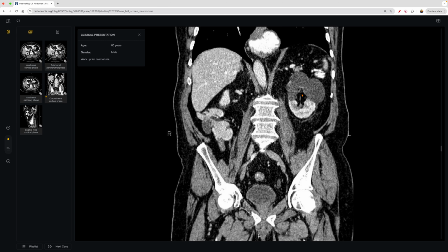And then as we go more posterior, we're looking for more kidney stones. Now let's jump our eyes to the right side. Not seeing any hyperdense structures, right? No hyperdense structures here. And then you can try to trace, look at that ureter right there. That's pretty nice. That's a very good view. And then you can go from there. All right, so that's what a kidney stone can look like in its most severe form. You get the hydronephrosis, some obstruction.